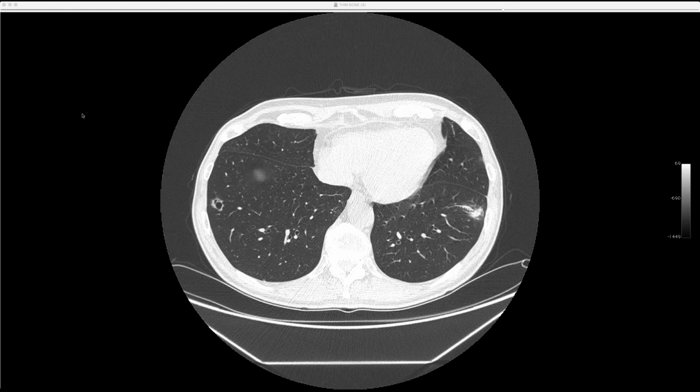But I've seen this when I see cavitary metastases. I think I ask whether it's a bladder cancer or some other urothelial cancer. Have you seen them but they never were solid from the beginning, unless we just missed our window? And I think you probably missed the window. Okay, that makes more sense, because I have not. I think they probably started out solid and then cavitated.